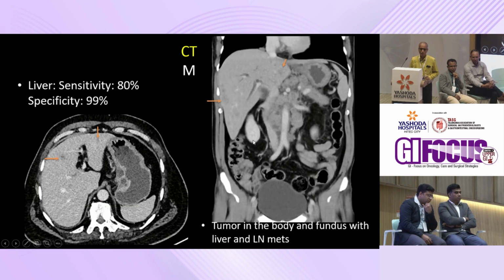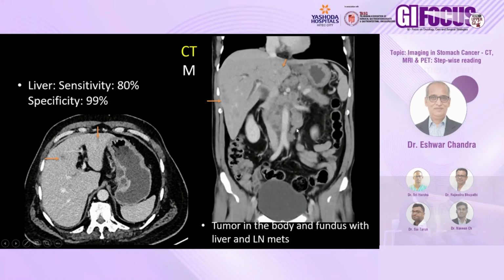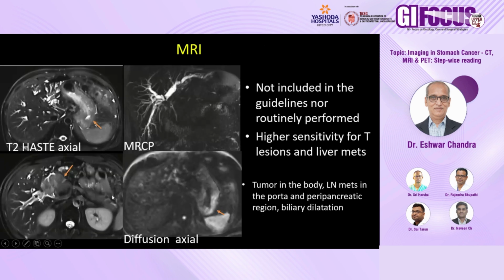Again, presence of lymph nodes, especially look at them in the venous phase, where you find that there are small subtle enhancing lesions in the liver. And also you have bulky lymph nodes in the para-aortic and aortocaval regions displacing the IVC in this particular patient, with two different patients with gastric cancer.